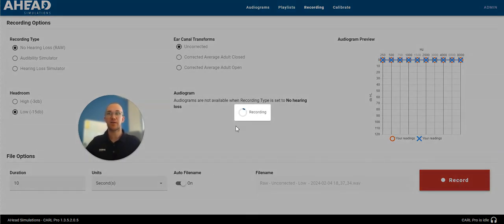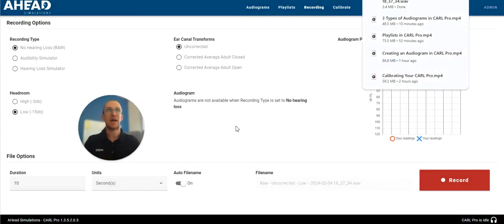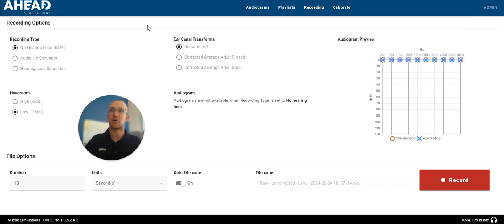So when I click record, you're going to see this overlay pop up. He is listening to everything I'm saying. He's over here to my left, so of course he's going to be hearing in one ear more than the other. And as you just saw with the drop down that came over my screen, it outputs the WAV file directly to me so that I can manipulate that or use that however I wish.